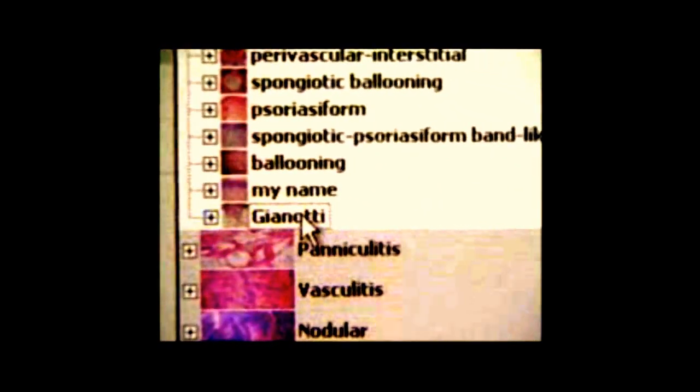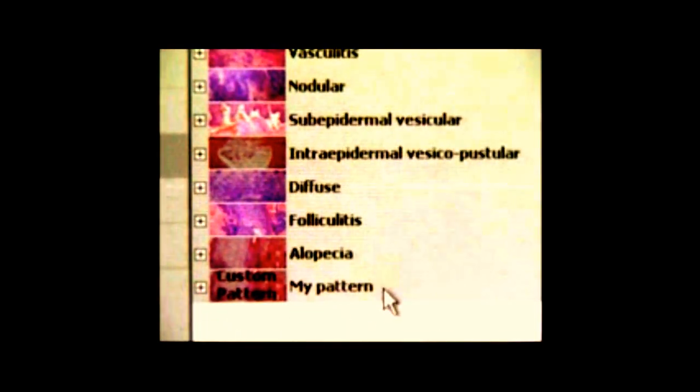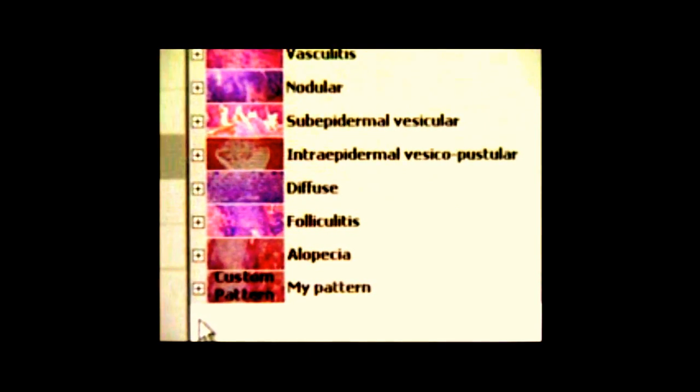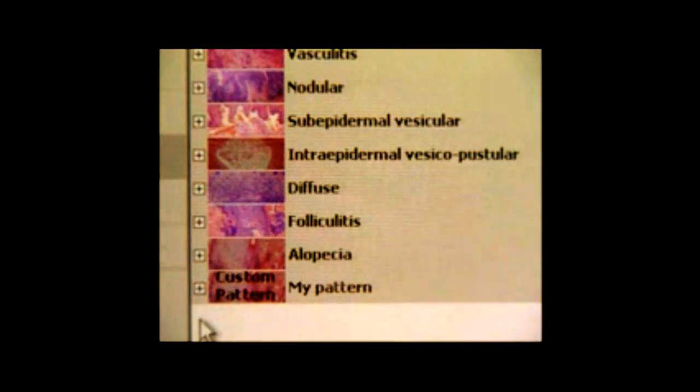Finally, you may add new sub-patterns that will store pre-existent diseases or new ones. Or add new patterns to store new sub-patterns. If you like, you can create new sub-patterns or patterns to store new diseases, labeling them in the way you like. You can also change the position of a disease from one pattern to another.